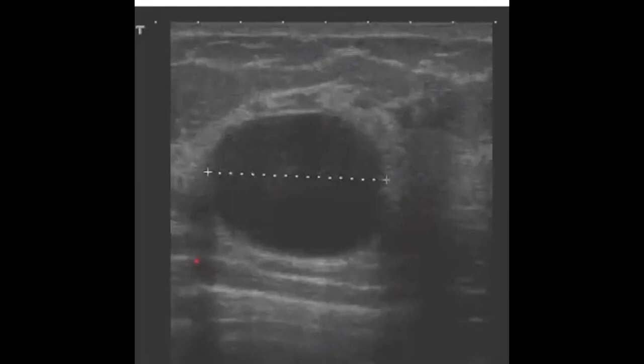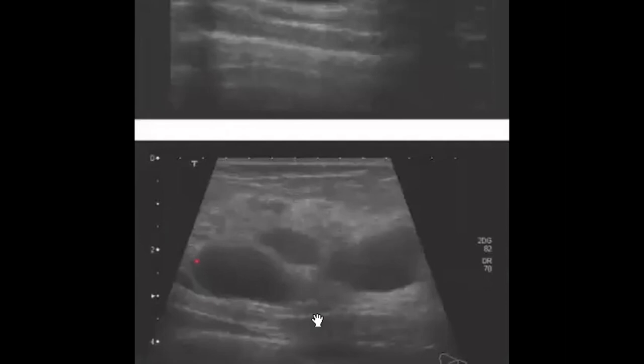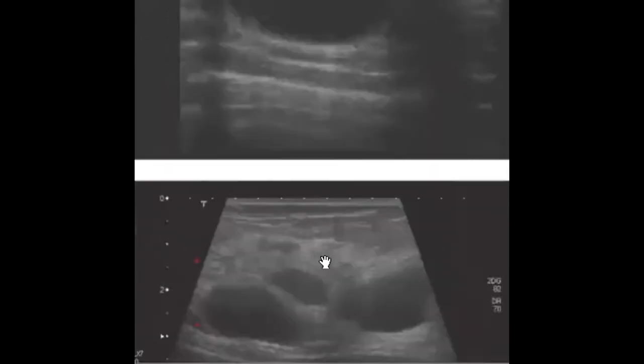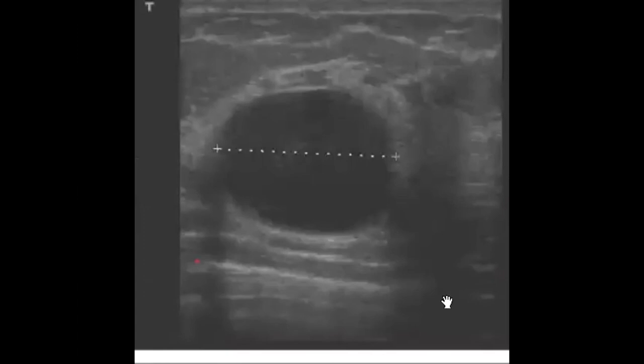Nice, Huda. So an anechoic lesion on ultrasound. This lesion is a mass lesion, anechoic on ultrasound. There is posterior acoustic enhancement, not shadowing. Enhancement. Perfect. And in the right breast, you can see that there are multiple similar lesions. So the left one was the largest one.